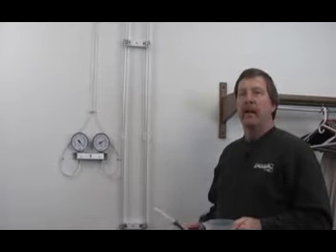The first shots of the vacuum system that we showed you were at the chair that would be located the farthest from the vacuum producer. The liquids that are sucked up in that line would go into the trunk line and travel from there all the way to the collection tank.